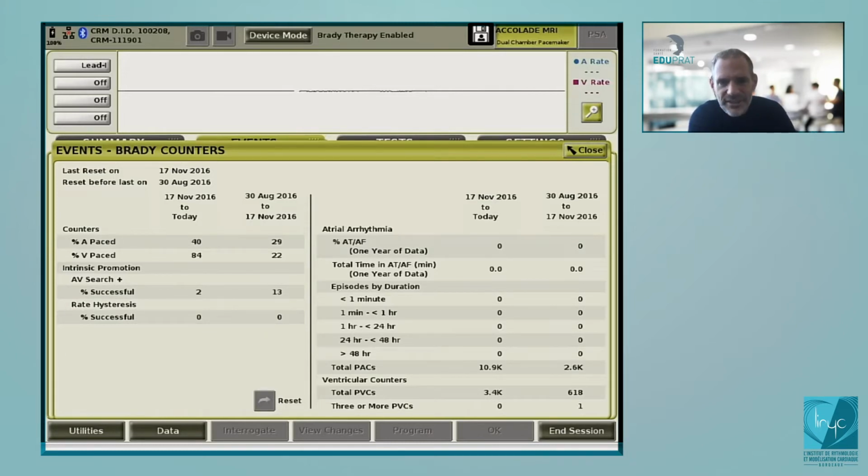You see here in this patient, you will know the percentage of time in atrial fibrillation and the amount of time. For example, you can see the patient has remained in atrial fibrillation for 2 months, 3 months, 1 day, 1 week. So you see the total percentage, but also the amount of time.